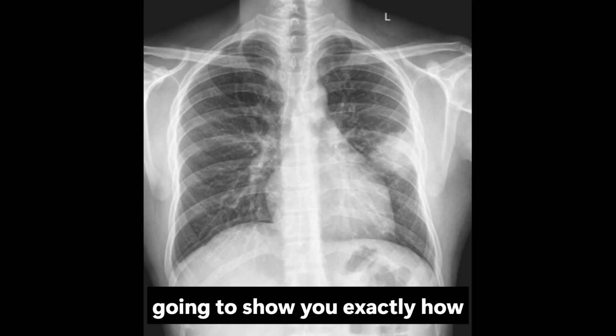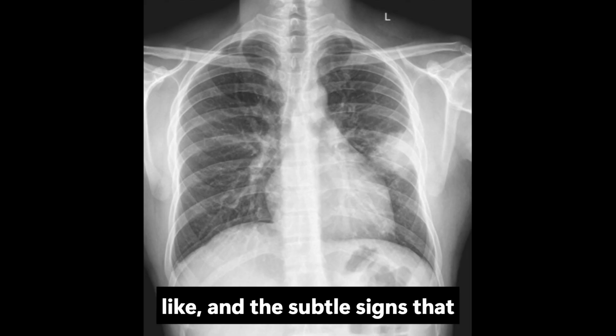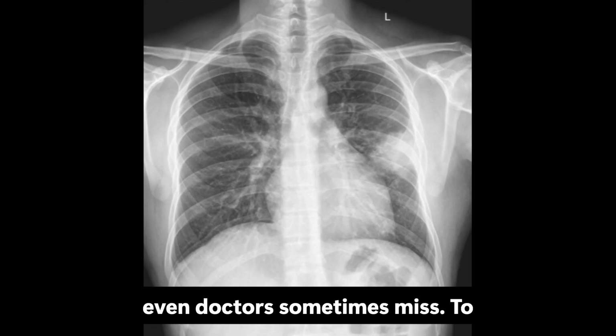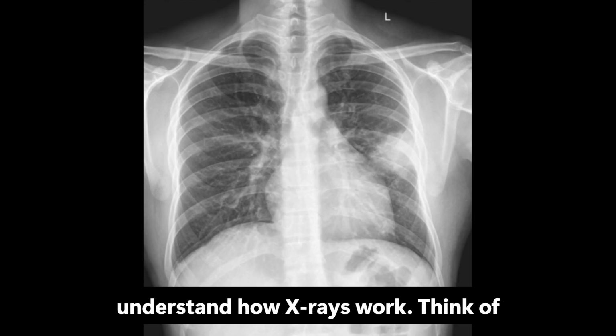I'm going to show you exactly how it hides, what consolidation really looks like, and the subtle signs that even doctors sometimes miss. To understand pneumonia, we first need to understand how X-rays work.